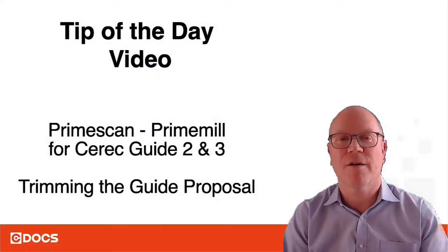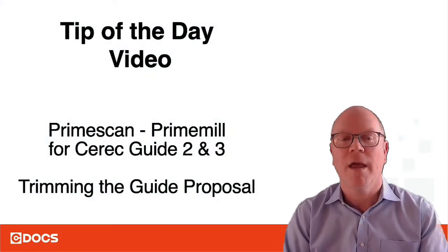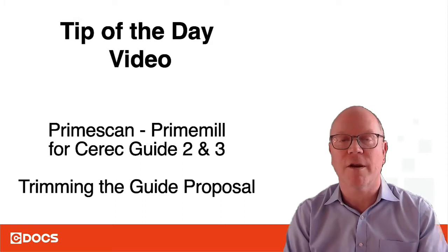Hi, this is Dr. Doug Smile from CDOCS, and today's Tip of the Day video is on the Prime Scan Prime Mill workflow for CEREC Guide 2 and 3, and it's trimming the guide proposal.